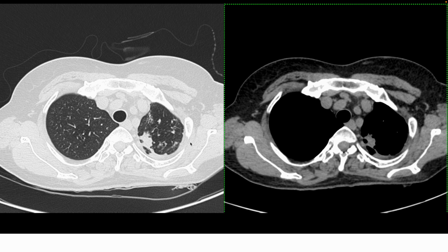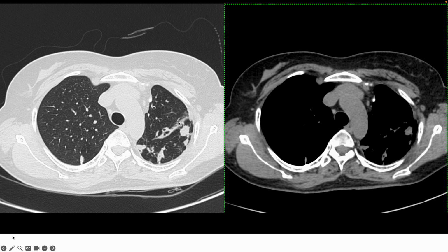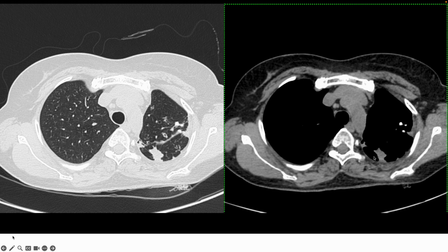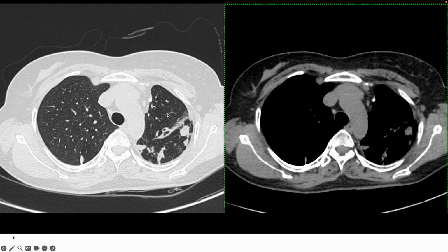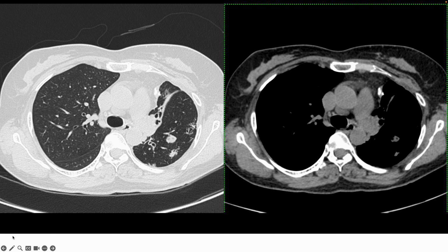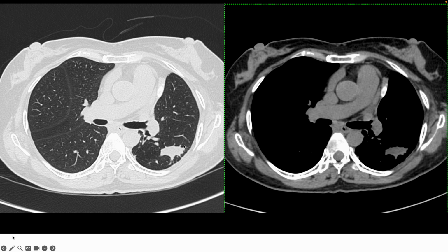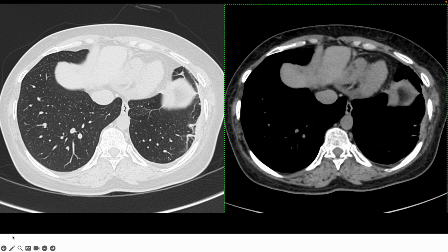So came for a CT chest yesterday, and we can see these clear signs of architectural distortion, post-infectious traction bronchiectasis, fibrocalcific and fibronodular lesions with significant volume loss. In the superior segment, which shows compensatory overinflation, we have cavitary nodules, we have these clustered centrilobular nodules and opacities, popularly called tree in bud at the periphery. And then again, we have some post-infectious changes here.